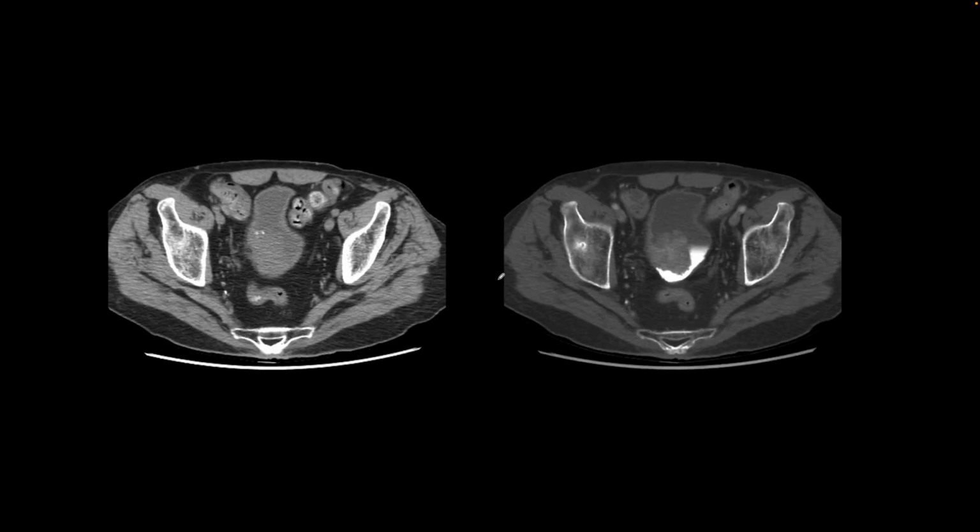This is our next patient, an older male who presented with hematuria, and we were suspecting a urothelial tumor. Urothelial malignancy is a disease of older men with history of smoking. We want to perform a CT urogram, where a CT is acquired without contrast, then post-contrast, and then we acquire delayed images. Most of the times the mass is arising from a wall of the urinary bladder and protruding inside, and so on the post-contrast images, there is an enhancing mass.